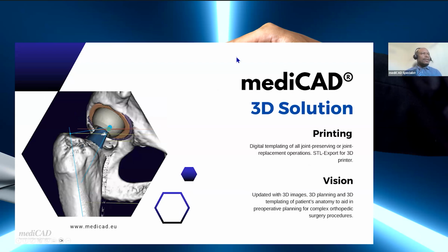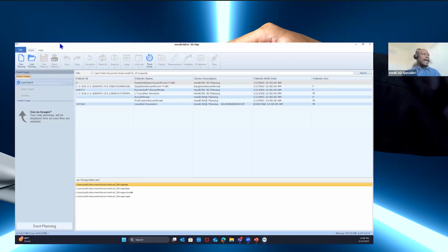Now I can go ahead and give you a quick background of the company, just a little bit more information if you have never heard of mediCAD before. So this is the mediCAD 3D premium solution. This one is the 3D hip module. If you have the software, this is what you see. This is the main screen of the software.